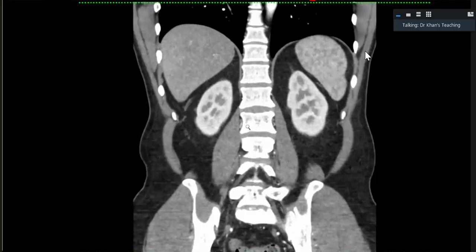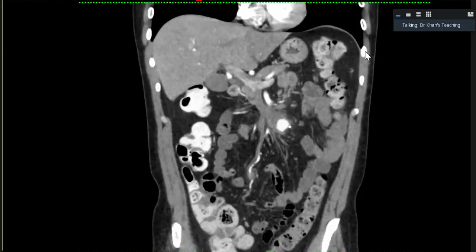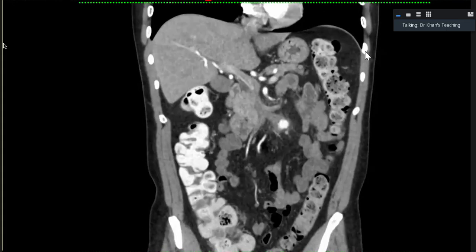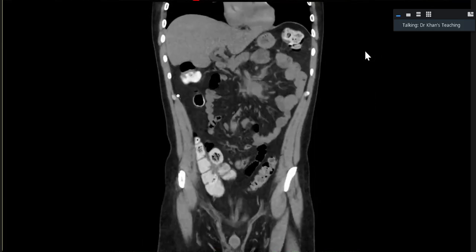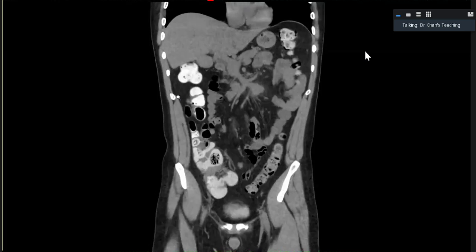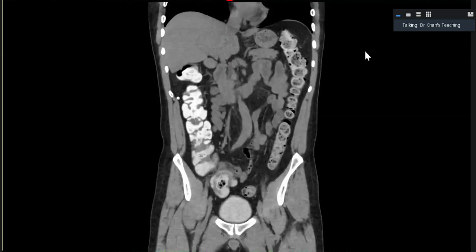As far as the pseudoaneurysm is concerned, this is the pseudoaneurysm in the mesentery. And as far as the duodenum is concerned, you've got these blushes there, for which you can confirm it in the exam, always ask for non-enhanced. And in the same breath, you should say that I will confirm it with a non-enhanced scan.